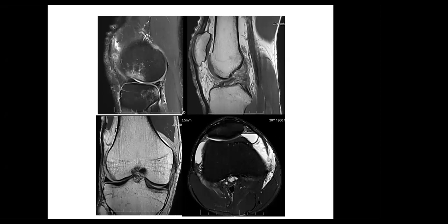Okay, I mean, you did well. Some of the observations are good. I don't know how you do the exam in Canada. So in order not to waste a lot of time on describing the MRI sequences, unless it is a requirement in your local training program, here we can just say multiplanar multi-sequence MRI scan of the knee. That's kind of your introduction to save you time, because they only give you 5 minutes.